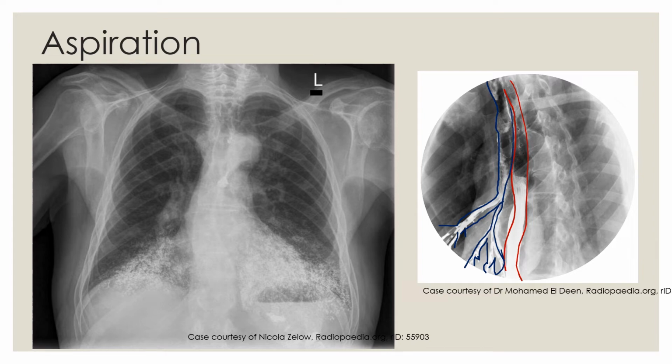Good. On this AP or PA erect chest radiograph, what we have here, we have normal anatomical structures. So we have, first of all, the bones. We have the humeri here, the clavicles. We have scapula, scapula all the way here. And we have ribs.